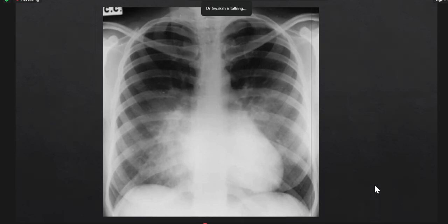Sir, soft tissue mass in the right breast. Too far-fetched. But yes, okay, that too. See, what I want to say is that you people have to discuss middle lobe collapse, and the DD is pectus excavatum. You have to know that A is followed by B. A is not followed by Z. So if it is a middle lobe collapse, the next DD should be pectus excavatum.